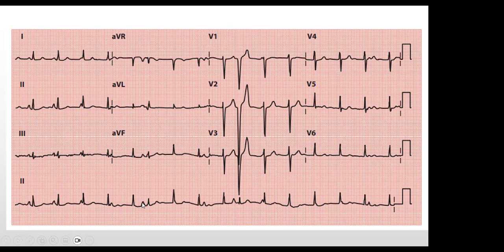And then you don't see any P wave. Then this looks like a P wave, then QRS complex, you can't see any P wave. Something coming after the QRS complex looks like a P wave of different morphology. And then you see another tall, almost peaked P wave, then another P wave again. Can't see any good P wave. So what do you think?